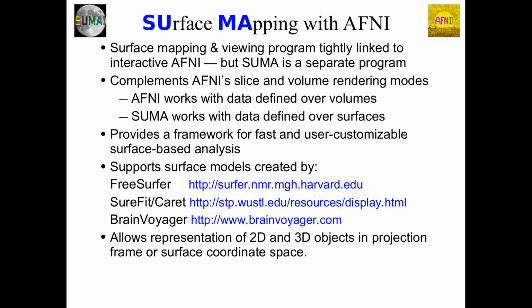So SUMA stands for surface mapping, and originally this was developed slightly separate from AFNI, but now it's just a part of AFNI. And when we refer to the SUMA functionality, again, we'll be typically talking about things that are embedded surfaces, one-dimensional tracts in 3-dimensional space, or 2-dimensional surfaces. And the nice thing is that, again, there's complementary functionality. Sometimes you want to look at data one way, sometimes you want to look at it another way.